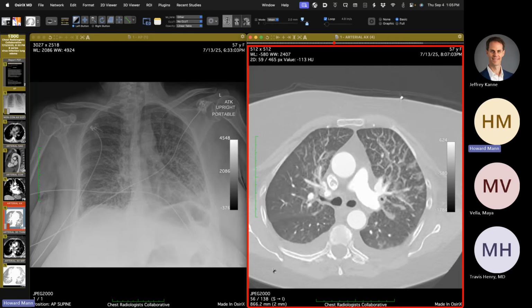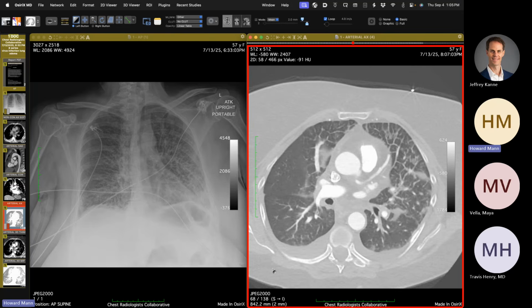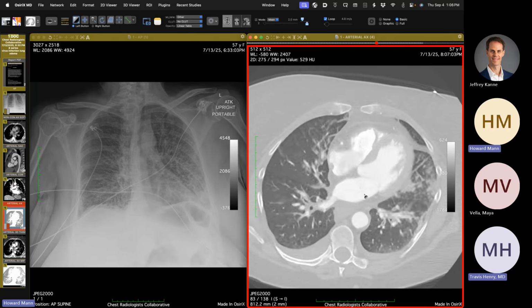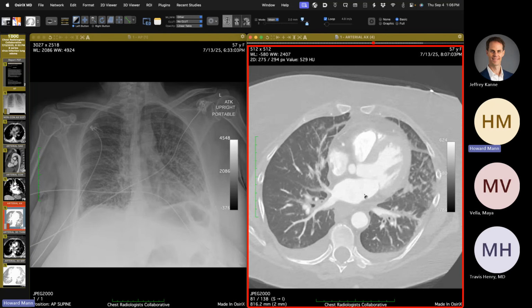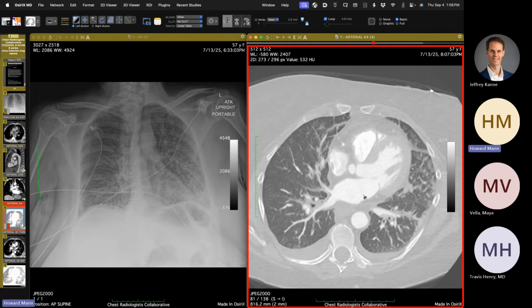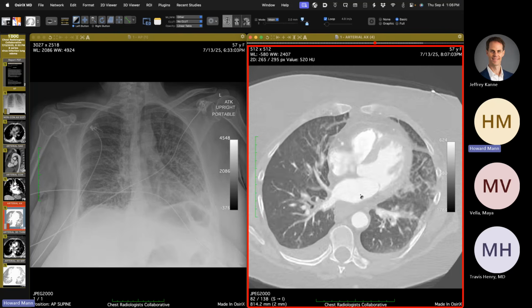And of course, you may not have cardiac chamber enlargement in a patient with acute MI. Yeah, the left atrium does look a little small, right? Or at least normal. Not enlarged, right. So we've mentioned pulmonary veno-occlusive disease, the unusual circumstance of obstruction of pulmonary lymphatics by tumor cells manifesting as florid interstitial lung edema.